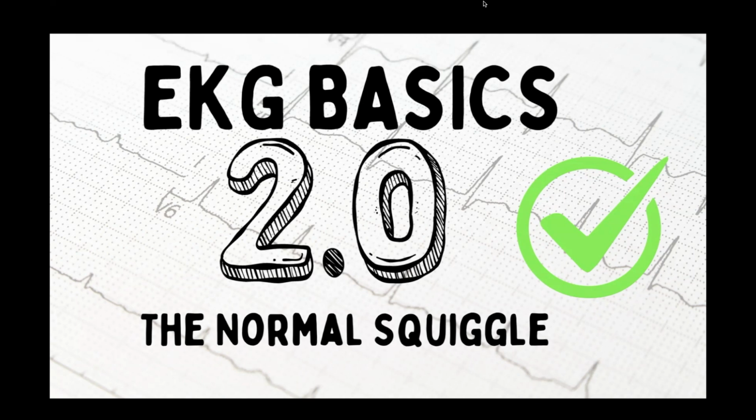We've had a couple requests for the basics of ECGs. Hey, I hooked the patient up to the monitor. What are some rhythms or ECGs I should stop somebody in their assessment to let them know that it's concerning, or something I want them to lay eyes on? Well, typical fashion, we're going to break things down into two parts. So the second part of this series will be that. The first part will be the normal squiggle. So what is good and how good happens.